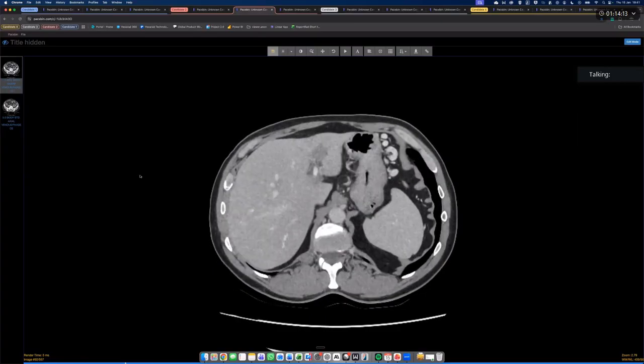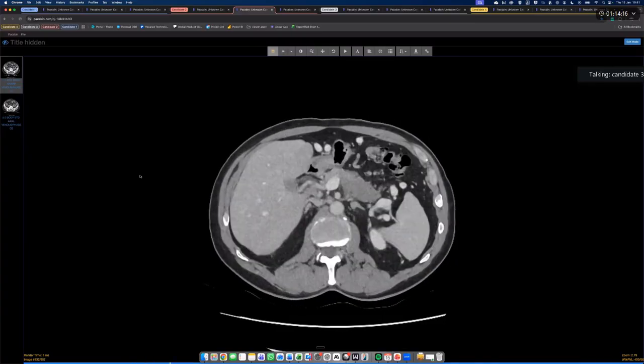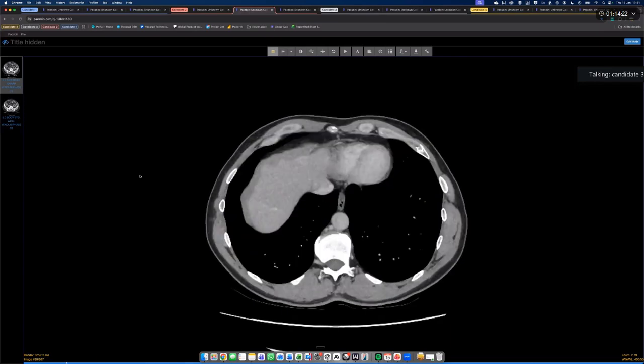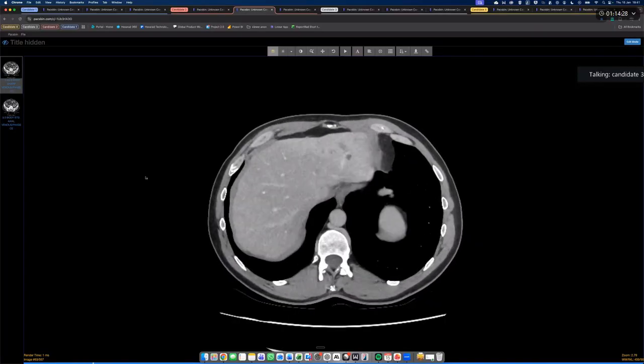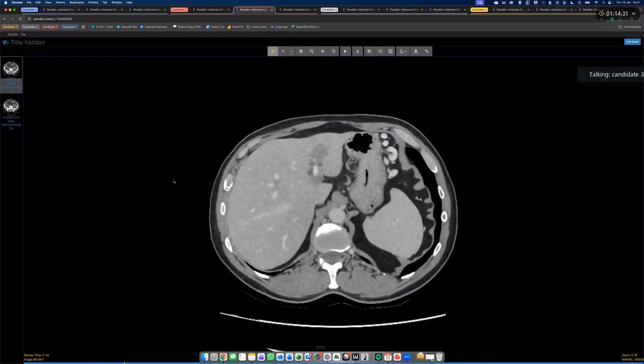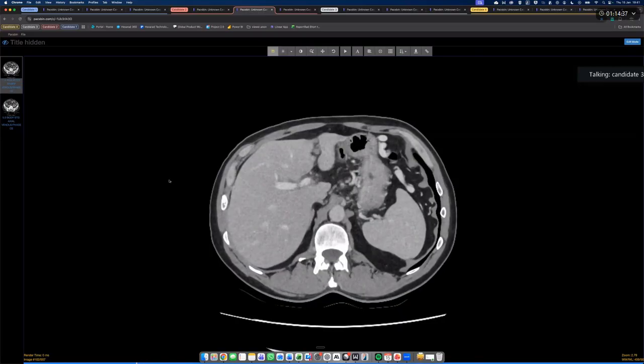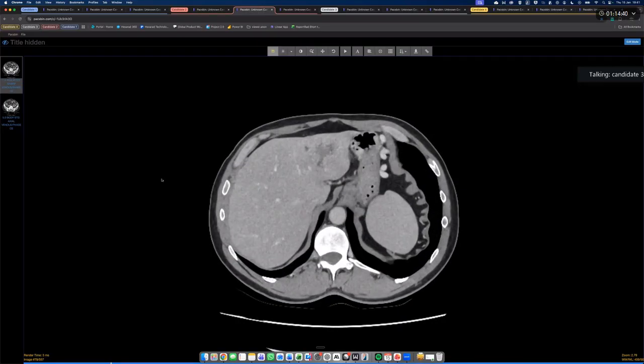I'm just trying to focus on the left lobe of liver again. Okay. So there appear to be a few hypoenhancing areas noted within segment 2 of the liver. Actually, the images are jumping a bit, so I'm not able to focus on one image. Yeah. So there appears to be a heterogeneously enhancing area noted in the left lobe of liver. So I would look at the other phases and further comment on these after looking at other phases.